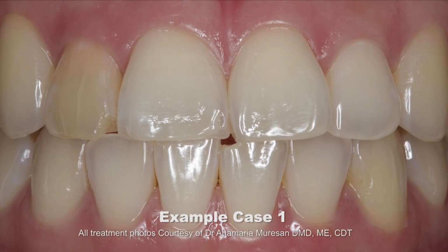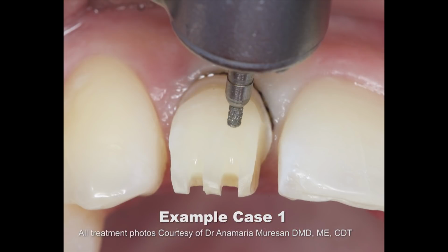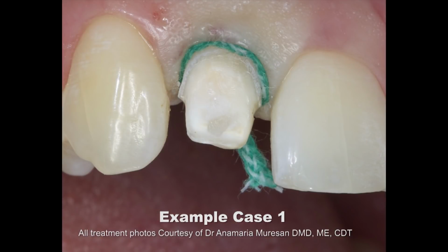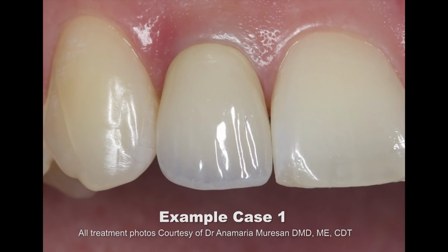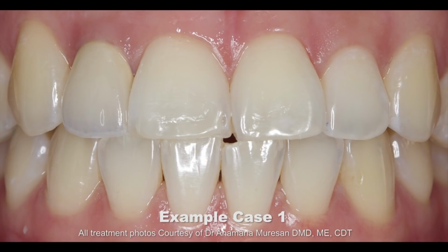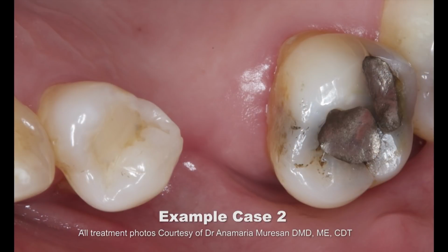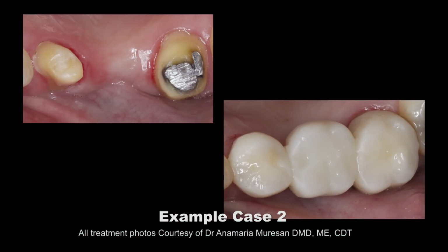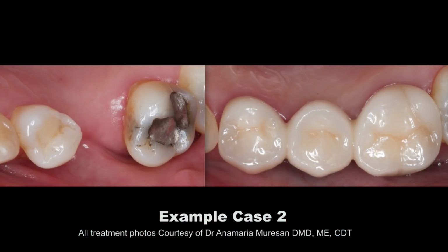Whether your photography is being used for marketing, education, documentation, or self-critique, the more you can make your photo stream complete, the more successful you will be in achieving these individual goals. I attempt to document my doctor's procedures from before treatment, shade, after preparation, stump shade, temporary stage, final seat, and the subsequent post-procedural checks. This data is also useful to explain the patient's individual treatment back to them and raise the value that the patient feels in their investment.